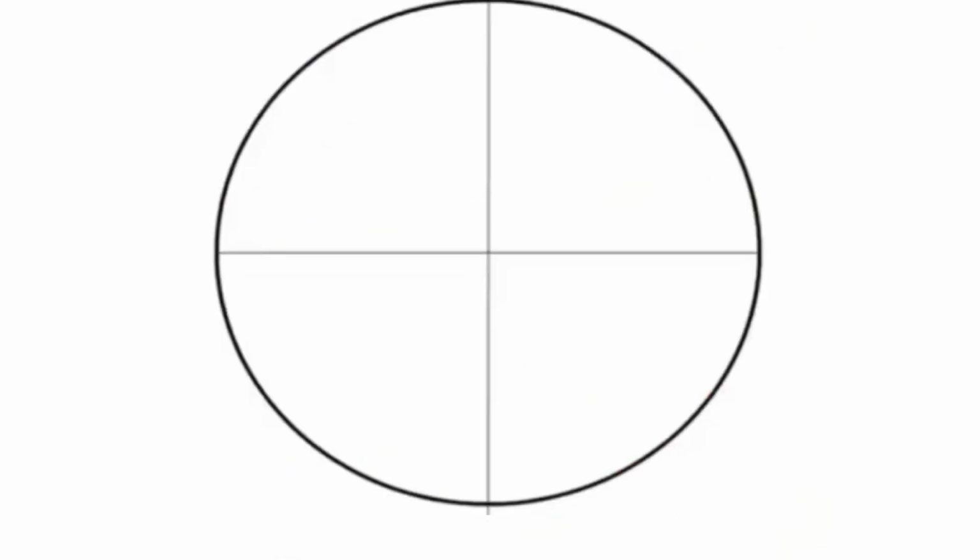For axis calculation we use the quadrant method, and most commonly we use two leads which are perpendicular to each other, that is lead 1 and lead AVF. We can also use lead 2 and AVL, and lead 3 and AVR, but most practitioners use lead 1 and AVF for the axis calculation. We use the quadrant method for axis determination.